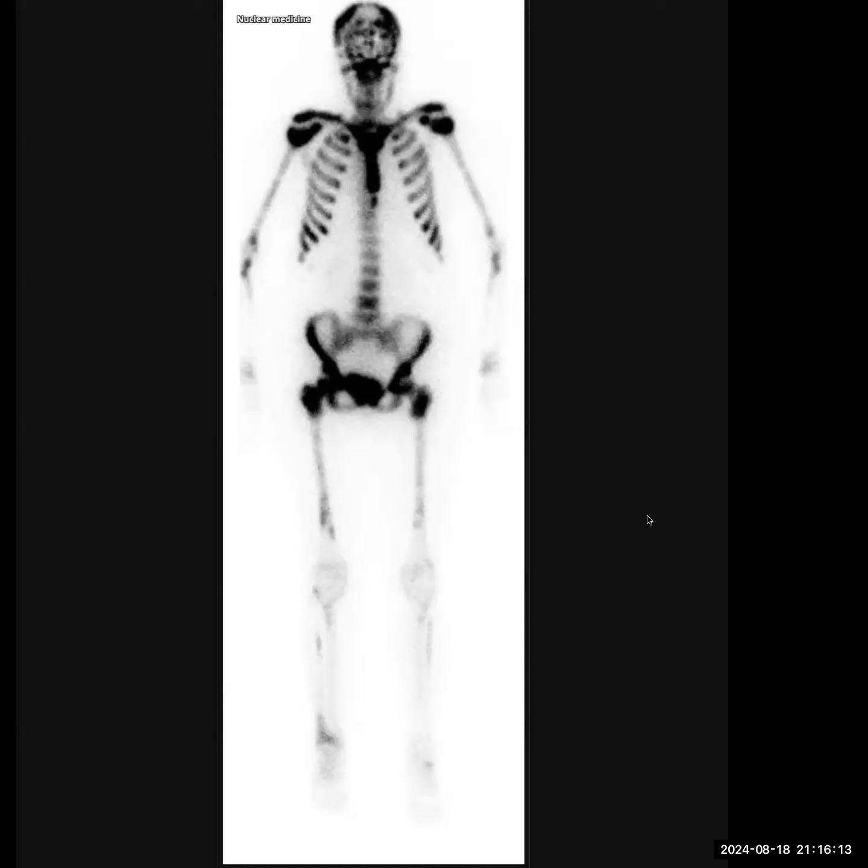So I think this could be metastasis as well. I would correlate with the history of the patient for any primary. They should explain the metastatic process in this patient. And I will convey these findings to the clinician. Patient needs a staging CECT, chest and abdomen, to look for any primary, what is the cause.